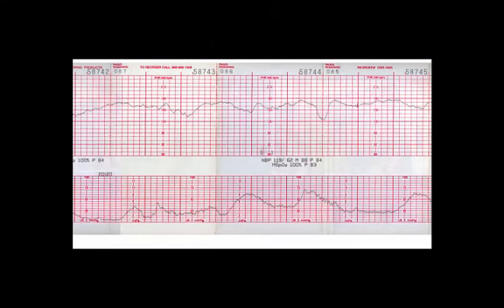It's maybe around 160 or 170. I see a few areas where it rests there, but it's really difficult to tell. The second thing we look for is variability, and this baby has minimal variability. There's not much change from beat to beat, much movement between each beat. Then we'll look for accelerations, which are difficult to find because we're not sure what the baseline is. However, if we said the baseline was 170, we don't have anywhere on this strip that it goes up to 190 and stays there for more than 20 seconds.